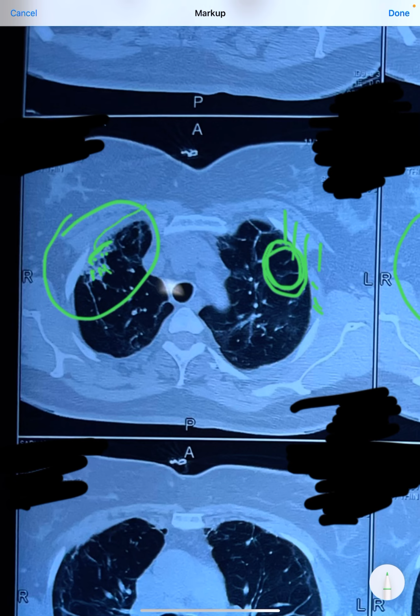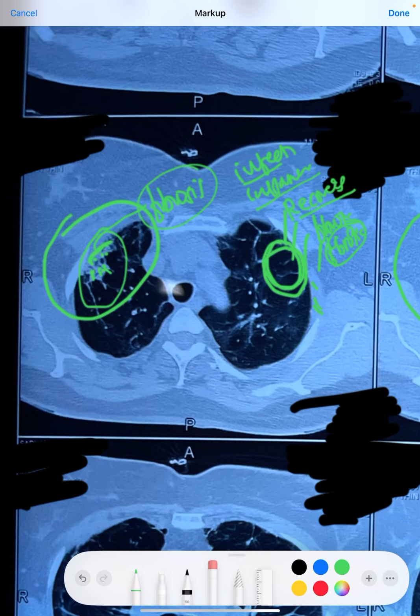This typically suggests fibrosis because whenever there is infection or damage, there is inflammation, and this inflammation either completely recovers, completely gets better, or it heals with fibrosis. And fibrotic bands are always dense white line-like lesions. So here this is very, very typical of fibrotic bands.